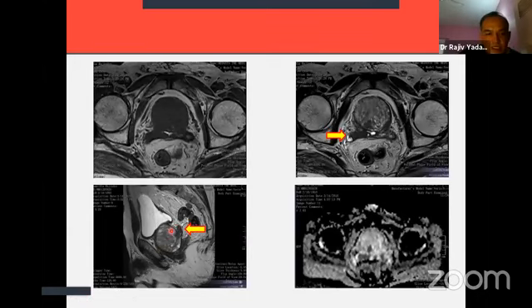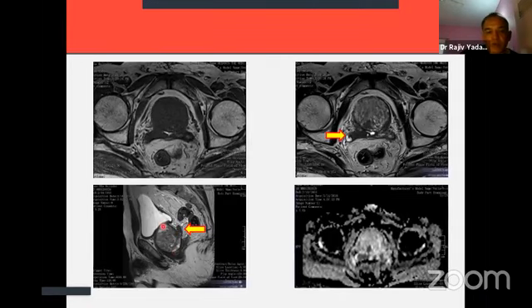So you see this sagittal, the only abnormal area is the base of the prostate and up to the mid of the seminal vesicle with type 1 invasion, meaning the tumor is going into the seminal vesicle only. The rest of the prostate, such a big prostate, is absolutely normal. And when we did DRE, we could hardly feel this. We couldn't even feel this area. Now, just because he had a previous negative biopsy and a big prostate, we are doing MRI in most of the patients. So you can see even a plain MRI. Here there is no contrast image. It's a plain MRI.